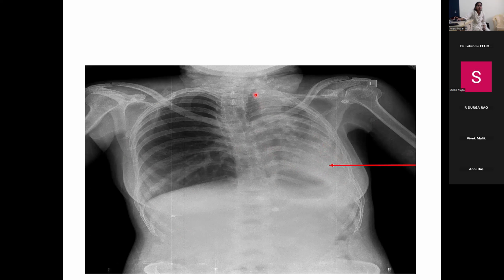Again here, there is a pull of the trachea towards the left. Okay, mediastinum entirely pulled towards the left. There is decreased hemithoracic volume on the left side. Right side has increased. See the gastric bubble, it has come up. Usually this should be down, because the heart is pushing the left hemidiaphragm downwards. But because of the pull, mostly the lower lung lobes have gone for collapse. Okay, that is why this opacity.